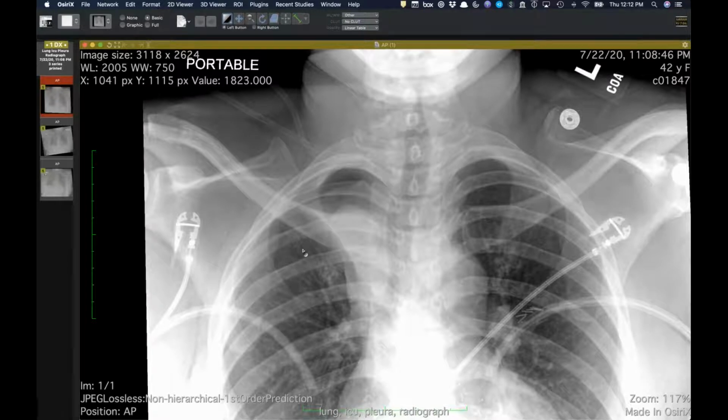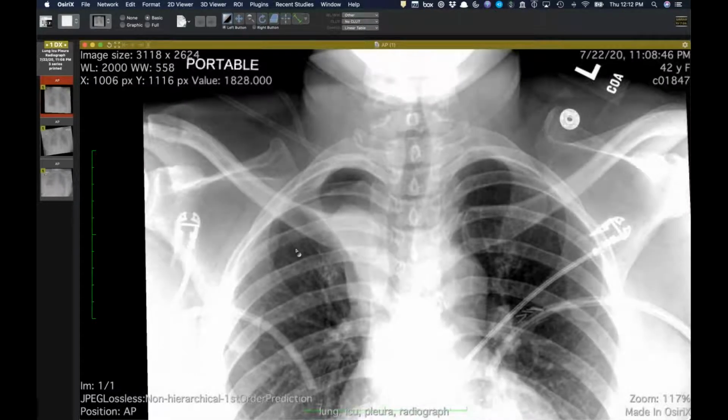So, Travis, is the idea that this is confined to this place because it's just filling the space evacuated by the collapsing right upper lobe, or is it thought to be extrapleural? Because I think these things usually stay very confined. I've seen it with right upper lobe or left upper lobe, and it's just exactly where that lobe was. It doesn't seem to track elsewhere. I think Howard's the one that's pulled up some of the original literature on this. I don't know the exact mechanism, but you're right, that's what we see in these all the time. I don't know if anyone knows for certain.